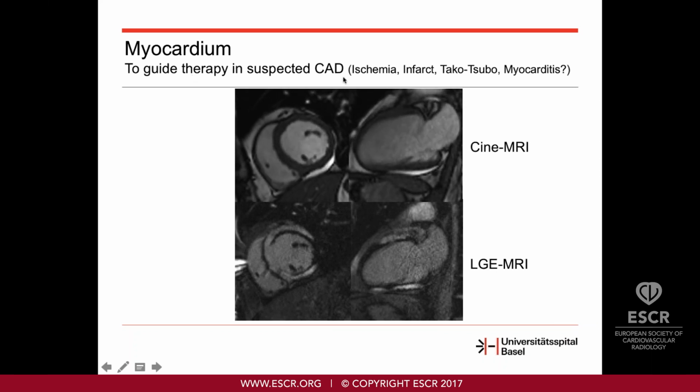This cannot be myocardial infarction because blood supply of the myocardium is from the outside of the myocardium to the inside of the myocardium. And so if this would be infarction, then the subendocardial area would have been affected also.